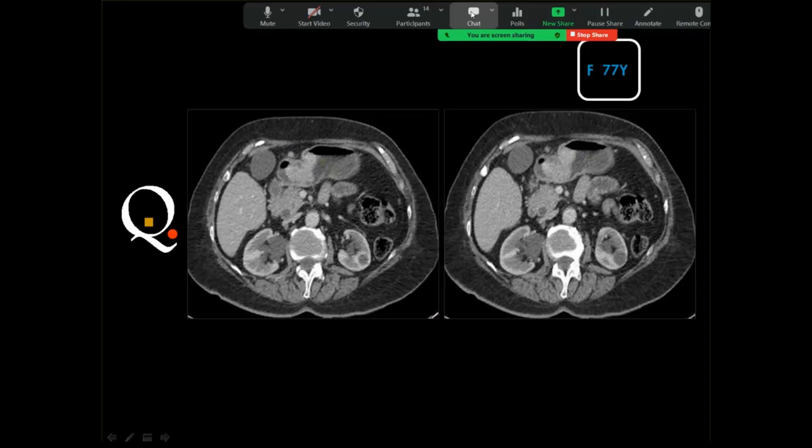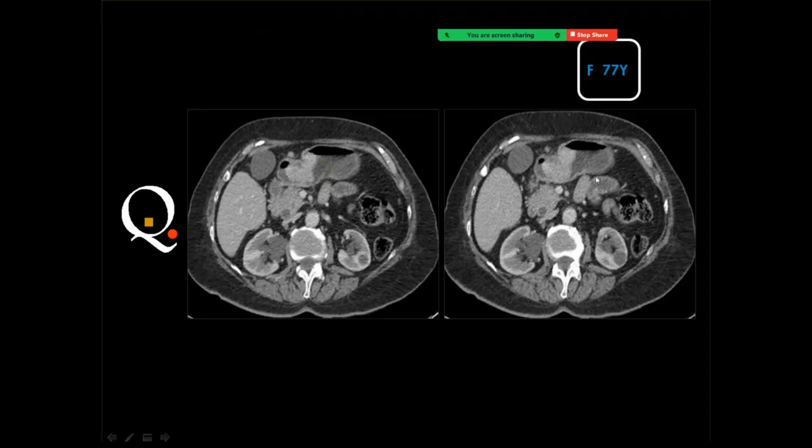Multiple lymphoma. Lymphoma where? In which organ? In the intestine. Yes, this is the small bowel. It's absolutely clear, but the main problem is here, inside the stomach.